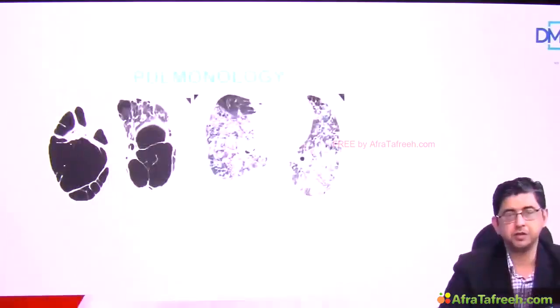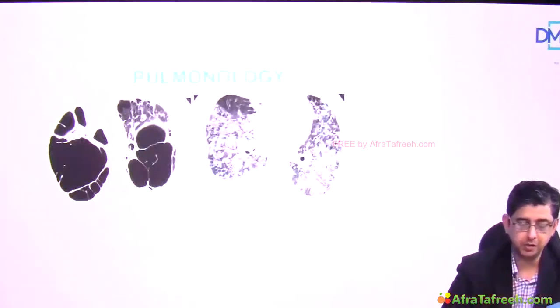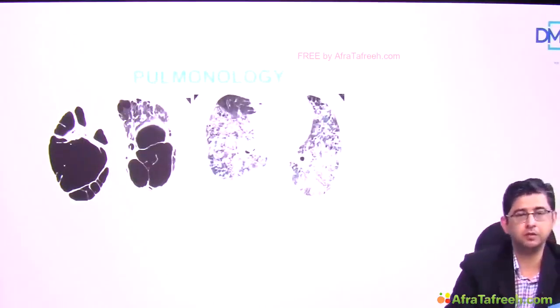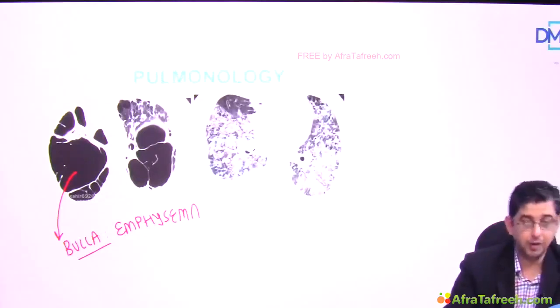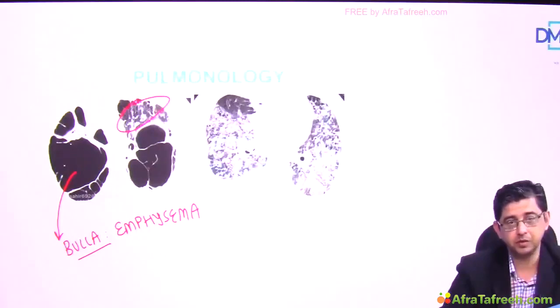Okay, guys, this session we shall be talking about image-based questions that are related to pulmonology or the respiratory system. In fact, I've deliberately kept these two very surprising looking images. These black, huge dilatations are huge bullae which can be seen on a CT chest in a patient of emphysema. You can notice that almost the whole of the lung has been damaged by extensive smoking, and only a limited part of the lung is normal in this case.